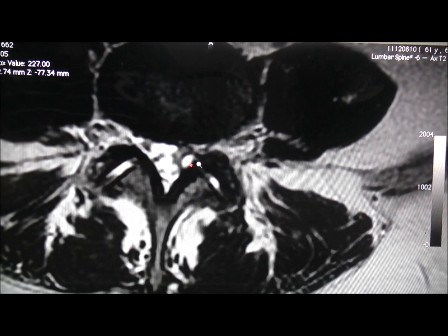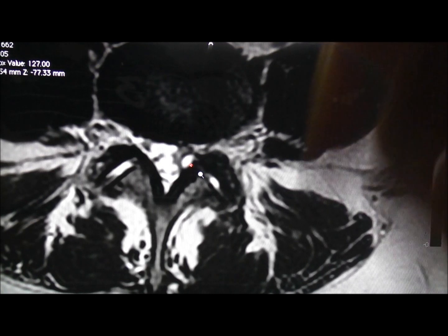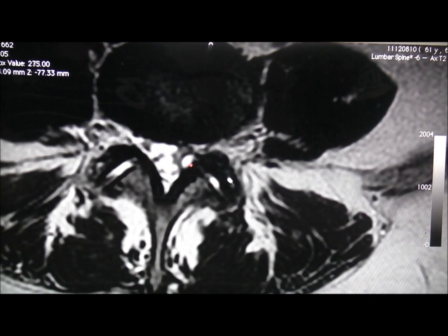Exactly. And you would have expected this patient in clinic to maybe have some kind of discogenic problem, possibly a prolapsed disc, because when she bends, she finds that it's worse. When she extends, it's worse. But believe it or not, the facets are in relatively good health. I mean, there is some general wear, but like I say, it's this cyst here.